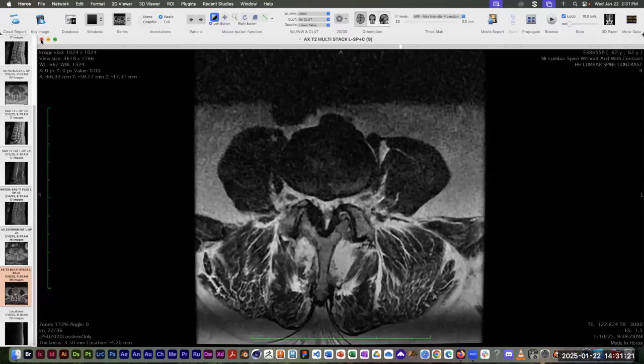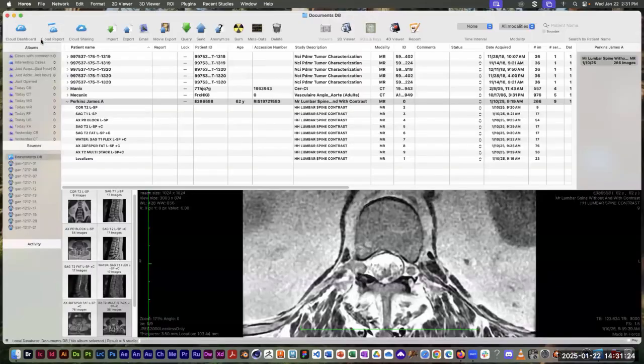I'm going to open up a different data set. One thing I know with MRIs, they don't reconstruct very well in 3D, and it's kind of hard to work with them. So for the rest of the demo, I'm going to focus on CTs. I just realized that our mice are also MRI, so I may not really explore those because MRIs don't make for very good 3D reconstruction. So let's focus on these other ones.